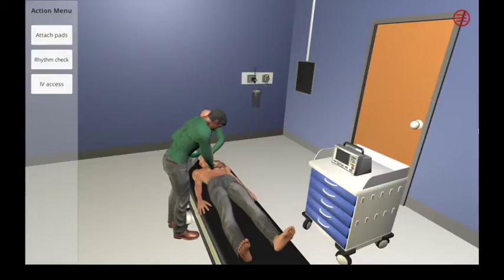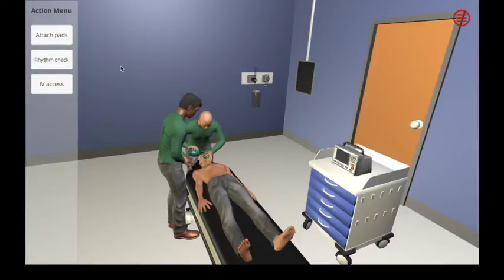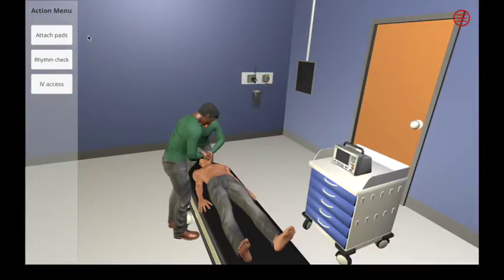When we were designing the software, we specifically wanted to make it accessible to any clinical staff who feel that they would get some benefit from it. We didn't want it to be limited to people who are familiar with modern applications. So we've opted for this very straightforward interface that consists of large, clearly labelled buttons, and perhaps belies somewhat the complexity of what's going on behind the software.